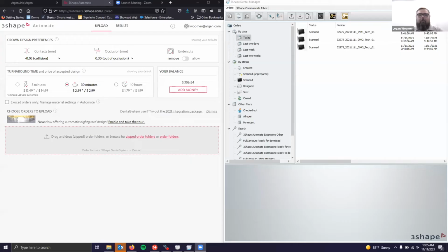So I'm going to go ahead and just share my full screen here. What I've done, just to prepare for this conversation with everybody, is I've already logged into Automate, and you actually don't need to log into Automate every single time or every single day. I've chosen to log into Automate just because I wanted everybody to see what my design settings are.